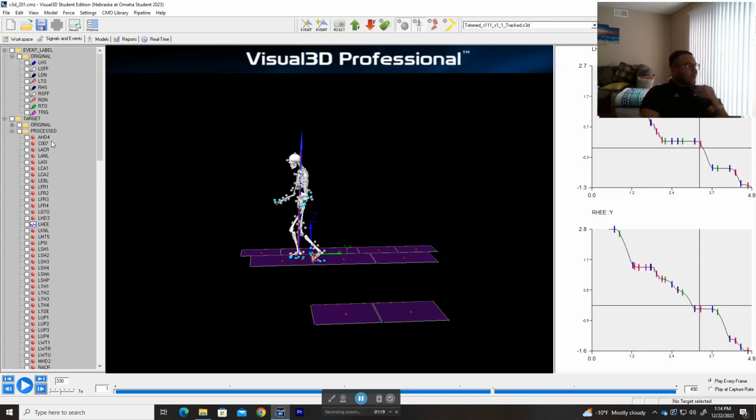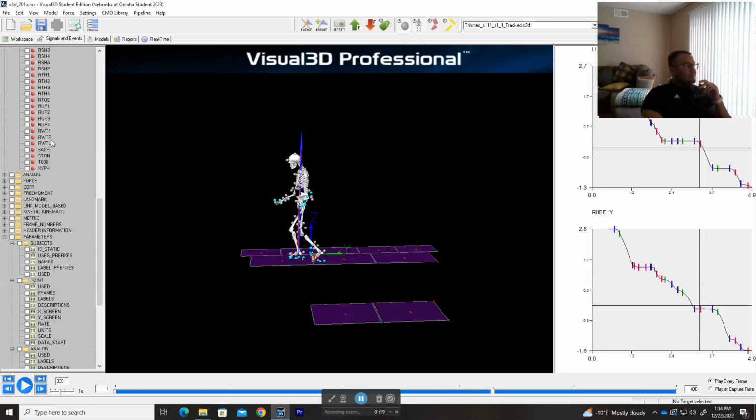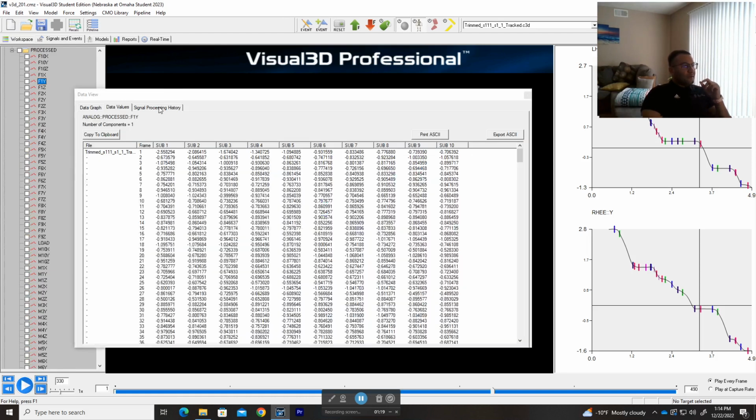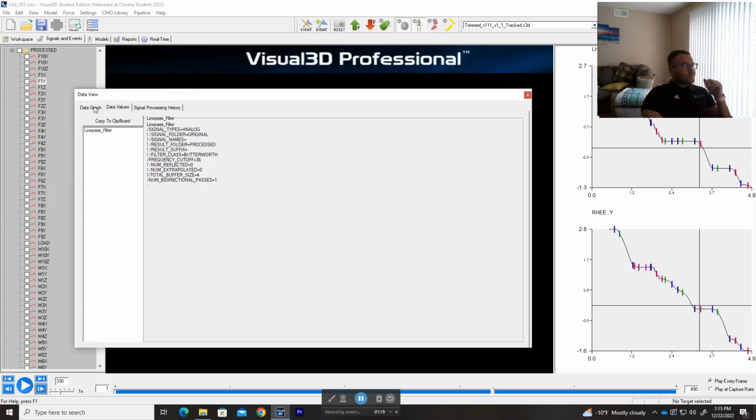Alright. And this is the same thing for every other data you use.